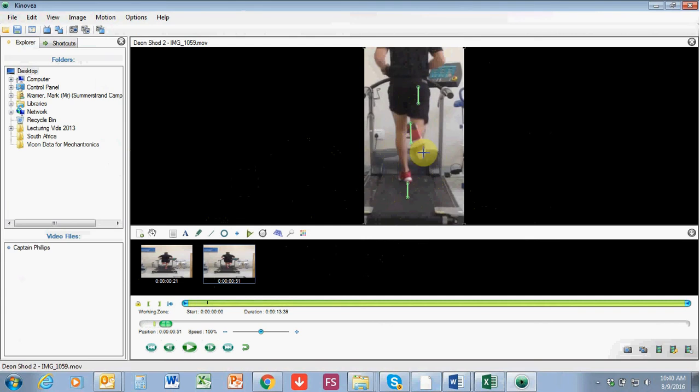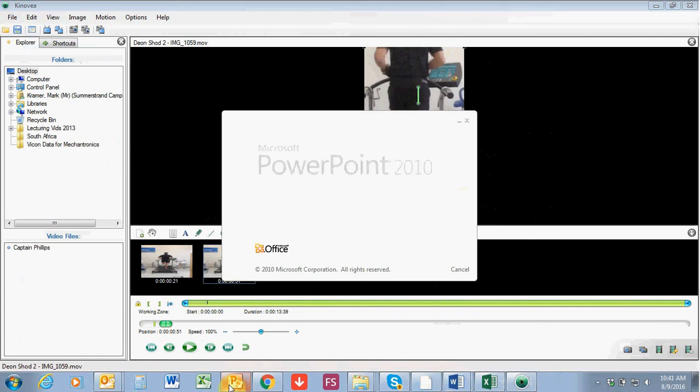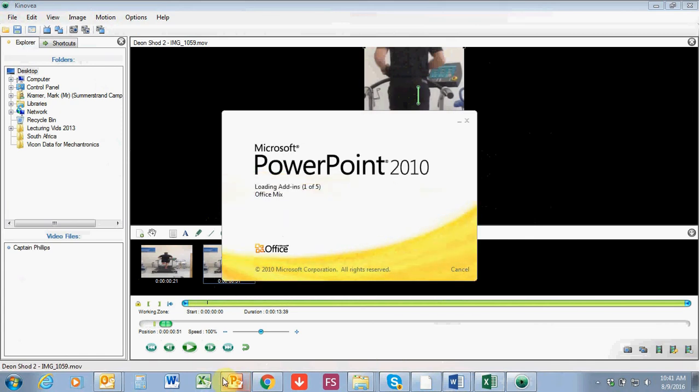Okay, so what I would do now is I would screen capture this and save it on a Word document, or what I typically do is I'll just open up like a PowerPoint, because it's easier to copy and paste things in there. So I'm just going to show you one, and then you guys can do the same thing sometime again. So just press the print screen option on your computer. I would open PowerPoint, and just wait for that to run.